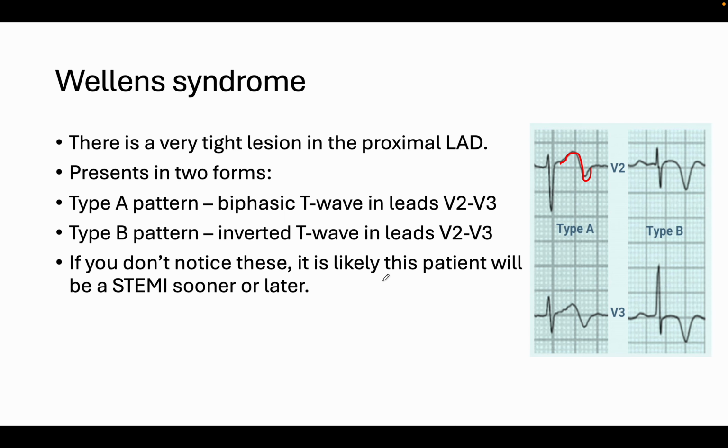Obviously, as mentioned earlier, if you don't spot these, they may present as your STEMI patient later on, maybe a couple of hours or a day or two later. So always nice to pick them up. And these patients typically have chest pain that resolves and comes back and resolves and comes back. So just do an ECG in those patients.